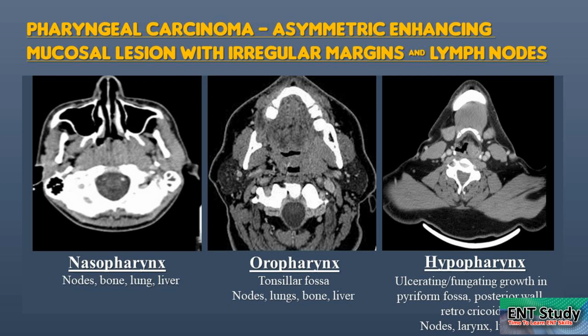But the beauty and goodness of CT scan is that I'll show you. I've kept an MR picture just to show you the neck, why I prefer CT over MR in these cases. On CT, fat is black. So the natural fat provides natural background, natural contrast, and you can identify if something is abnormal in between.